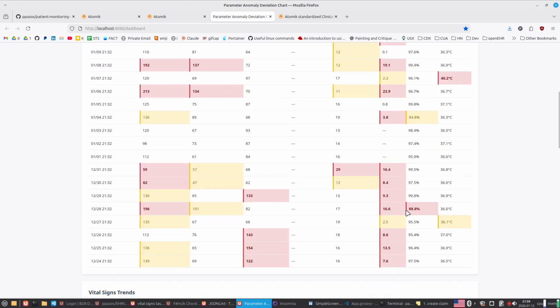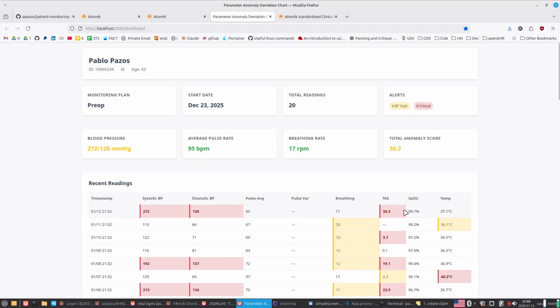If you have more complex dashboards or reports, stuff like that, that you want to fill with different information, you can create 10 queries if you want. And it will take you maybe 5 minutes to create each query that you need. Imagine that versus needing to talk with an engineer, telling them what you need. They need to go to the database. They need to program the queries.